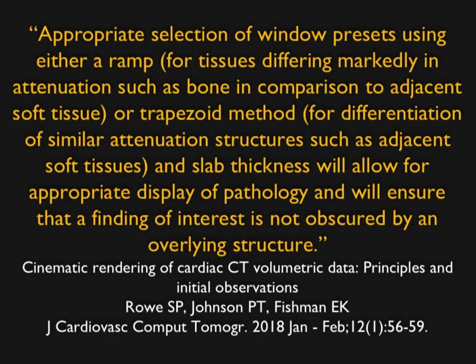And a key point, which is true with all rendering, from MIP even, though probably least because it's easy to get good MIP images, is that with cinematic, it's very important to get the right parameters. We have spent almost 2 years getting the right parameters. If you look at some of the recent articles published that were not from here, the articles are less than optimal because the images are less than optimal. They were published because of the word cinematic, but the images were really poor. So just because you use cinematic does not mean you're going to do a good job.